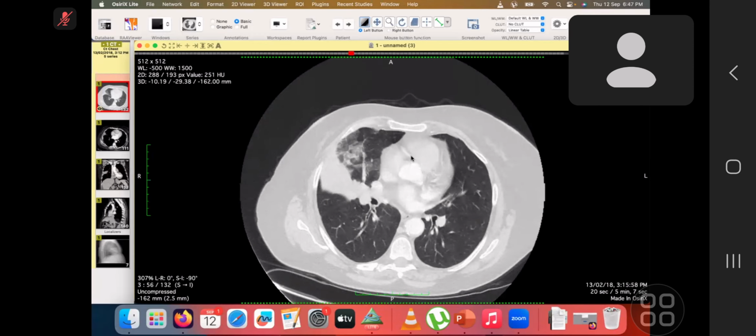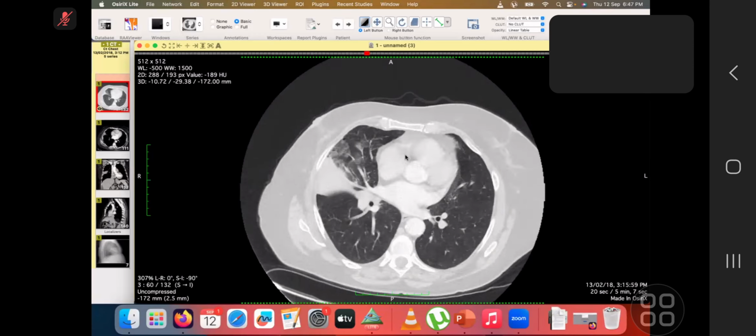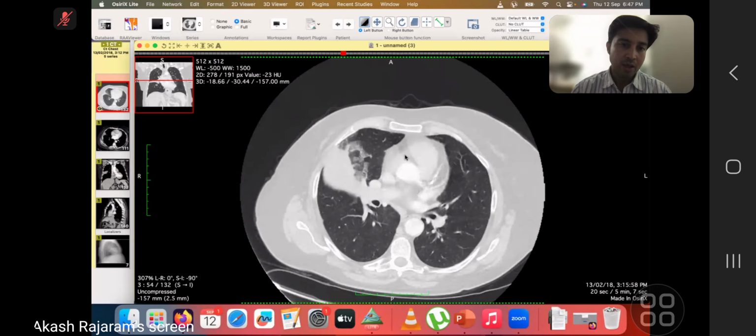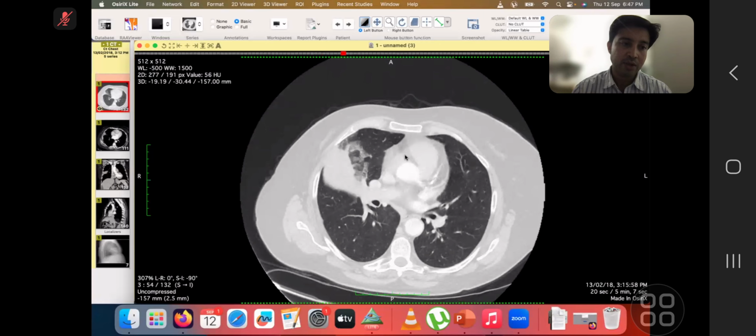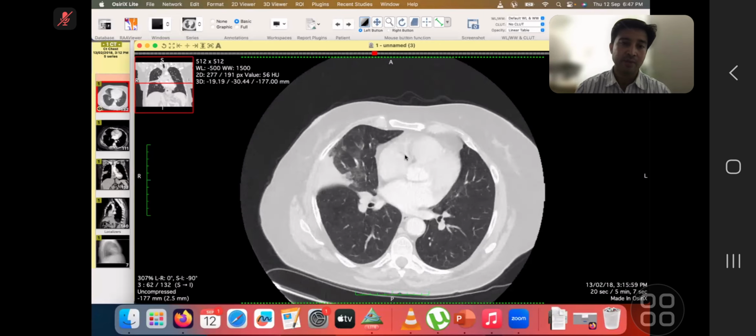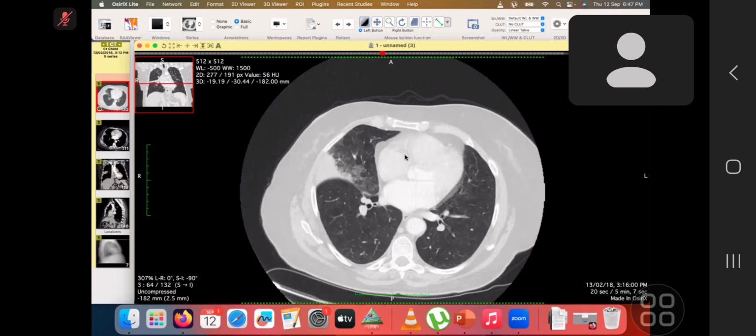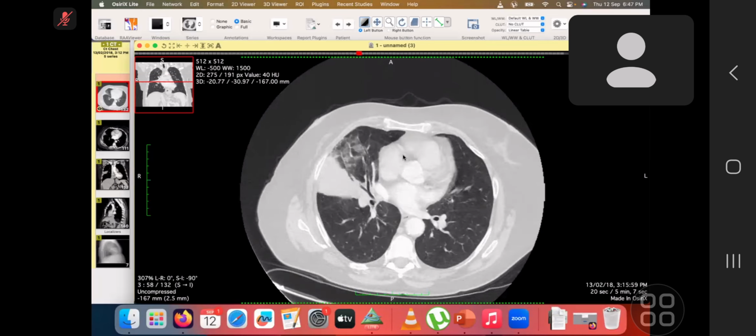Was any clinical history provided? Can't remember if you told me at the beginning. Yeah, as I mentioned, it was a right chest pain and dry cough. Also, the patient had a known case of CA breast some time ago. CA breast, okay. So I think infection is within the differential, but given there is a focal dense region of airspace opacification with no bronchograms, an underlying mass lesion can't be excluded on this study.